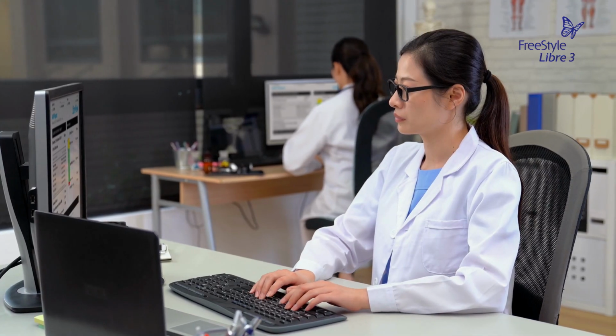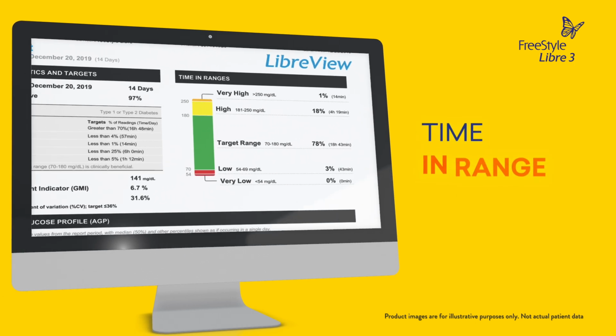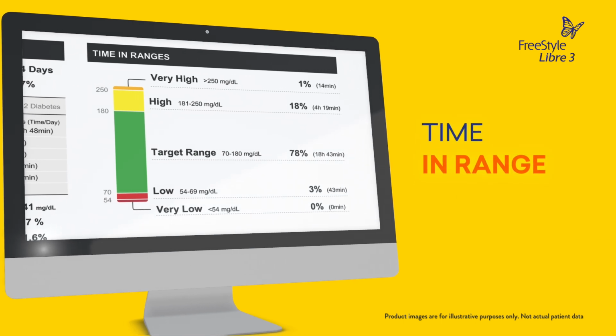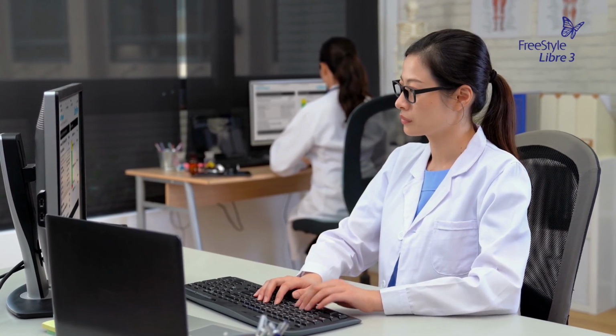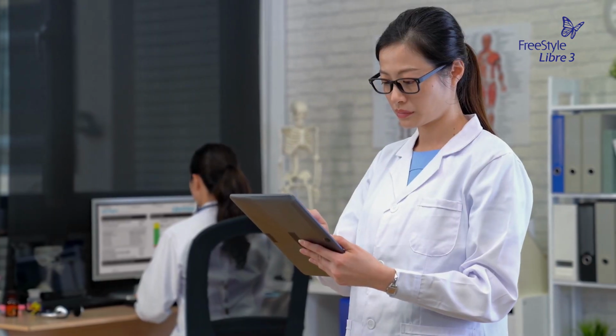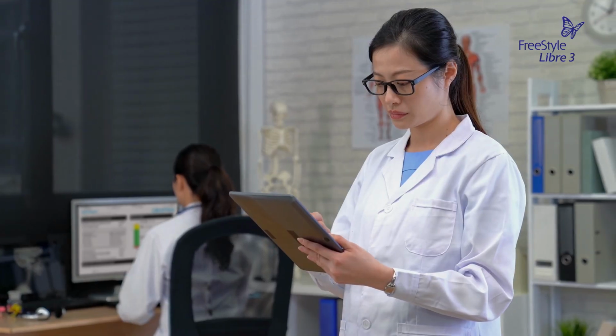Your doctor will use your reports, including time in range, to help identify glucose patterns and trends so they can make more informed treatment decisions regarding your diabetes management. And they can use LibreView from any internet-connected device.